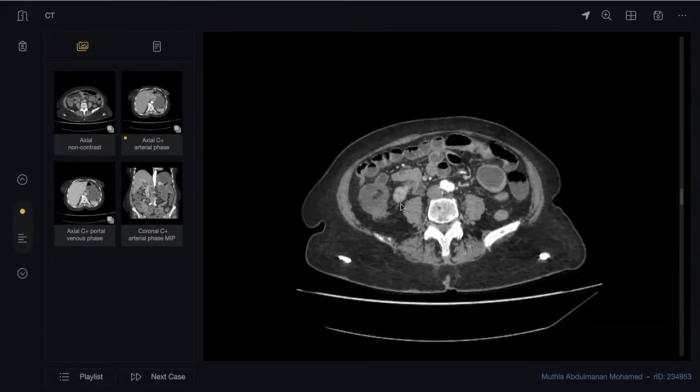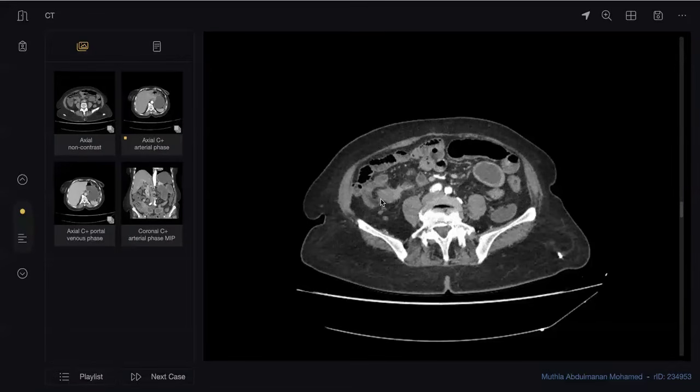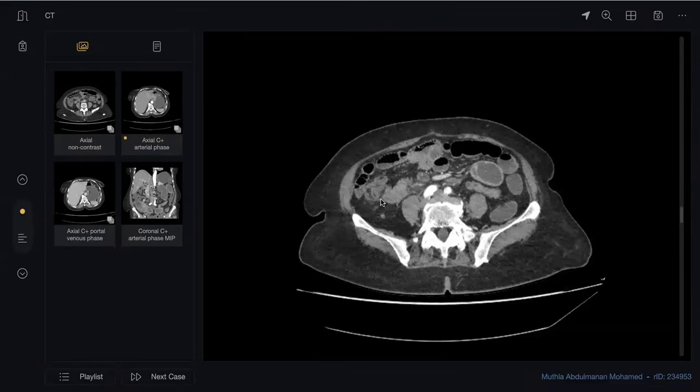With complicated bowel obstruction and intussusception and metastatic lesion to the liver as well. In my routine practice, I will check the bone window as well. If there is any metastatic bony lesion, I will refer the patient to the GIT oncology team, and I will complete my metastatic workup for the chest, abdomen and pelvis. Okay, and what is the next best investigation to prove your diagnosis?